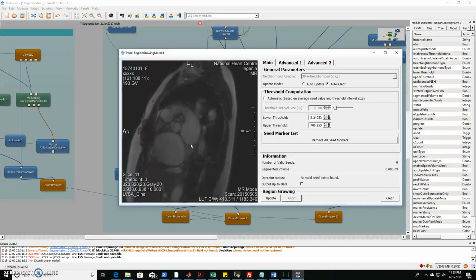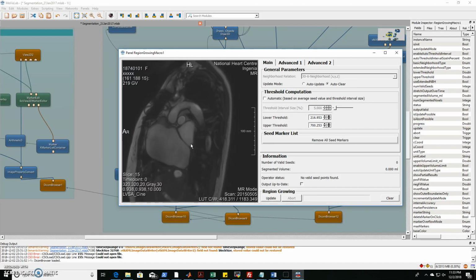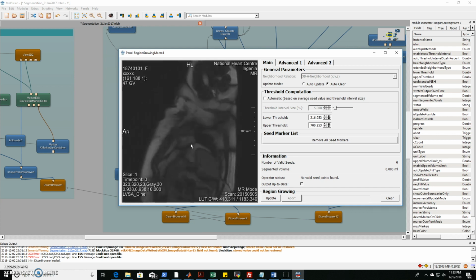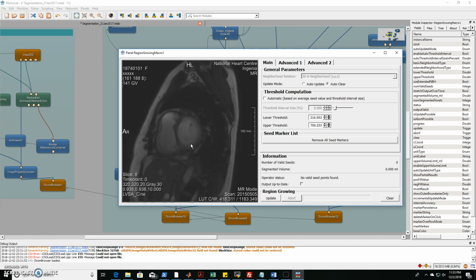At this point, I'm going to share how to go up and down. To move longitudinally throughout the heart, you're going to use the up and down arrow keys. That will go all the way up and down the individual, and you can see the ventricles right there. And if you use the left and right keys, you're actually changing the time point, so you're moving with respect to time. If you hold down the left key, it scrolls all the way through, and you can see a full cardiac heartbeat.